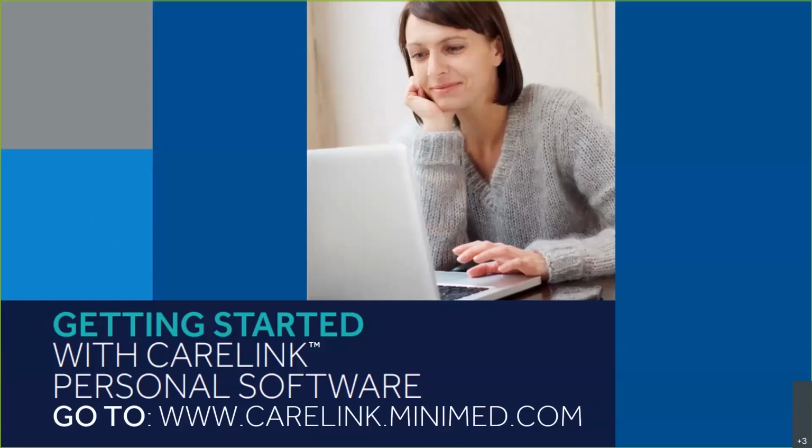Thank you for sharing. Let's start with the basics and learn more about how CareLink personal software can help you with your visits between you and your healthcare provider. CareLink personal software is a therapy management software for people with diabetes. It provides personalized insights to empower you to make diabetes therapy decisions. This software helps people manage their diabetes by converting data from your insulin pump, continuous glucose monitor, and blood glucose meters into easy-to-understand reports, providing insights about your sugar levels.